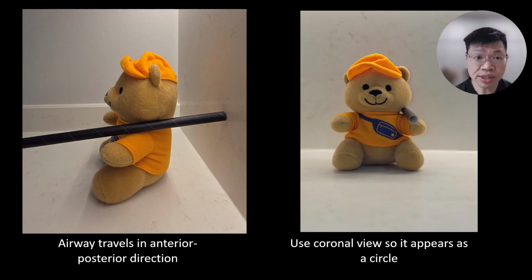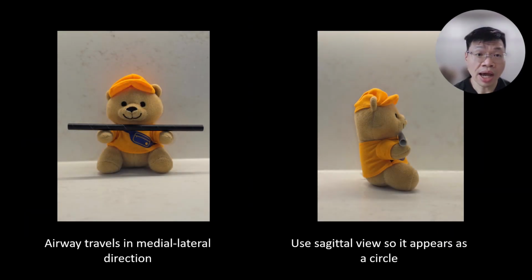A quick revision: if the airway travels in the anterior to posterior direction, as shown by the straw in the left-hand image of the teddy bear, using the coronal view will help us to see it as a circle. And if the airway travels in the medial to lateral direction, using the sagittal view will help us to see it as a circle.